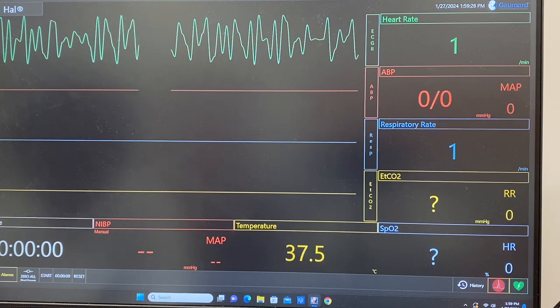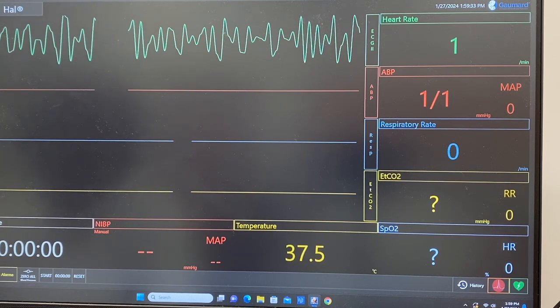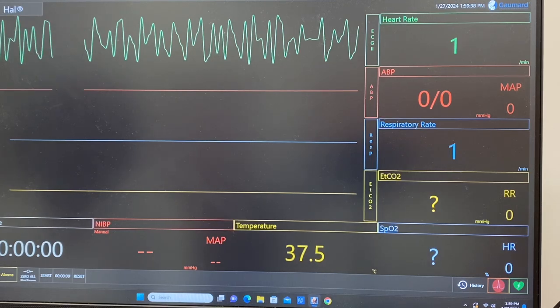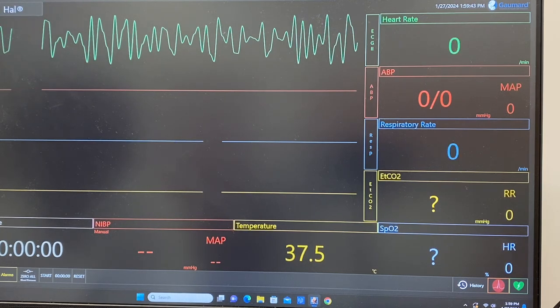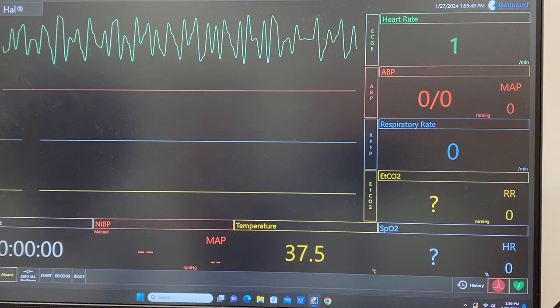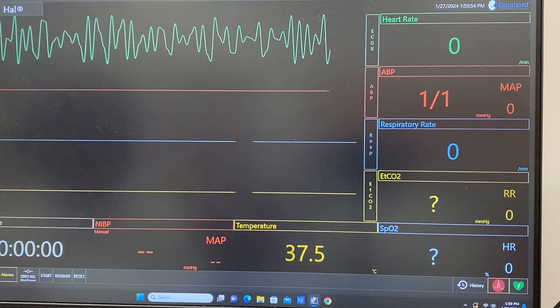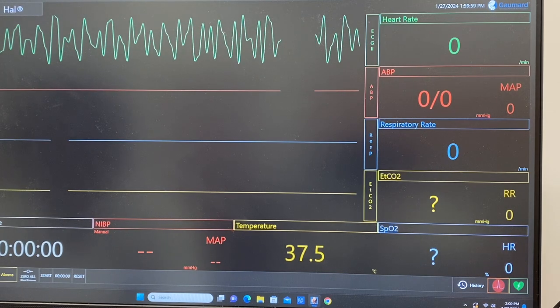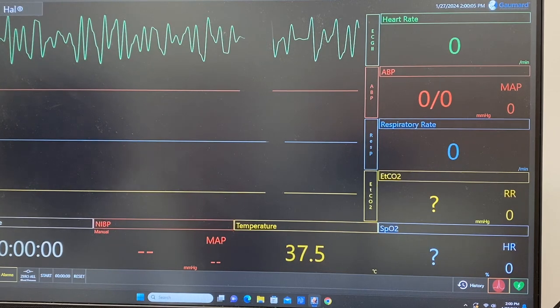There's two kinds of fibrillation, right? One with narrow looking QRSs, and this one has wide, no nice looking QRSs. The one with narrow looking QRSs but with disorganized or indistinguishable P waves is called what? AFib. Here, you can't even tell what's what. There's no good narrow looking QRSs, so therefore this is a VFib. It's a disorganized rhythm. It's just fibrillating, nothing's going on there. What do we do? Defibrillate. Good.